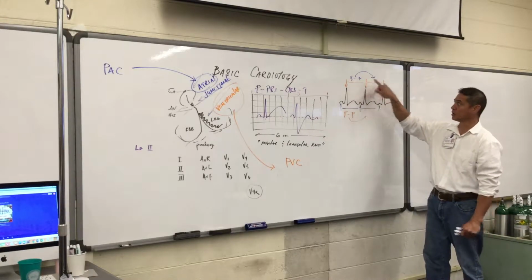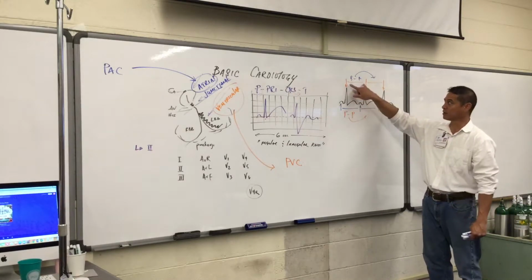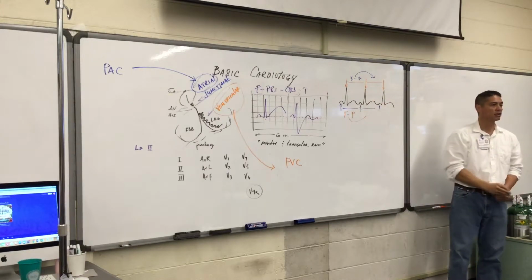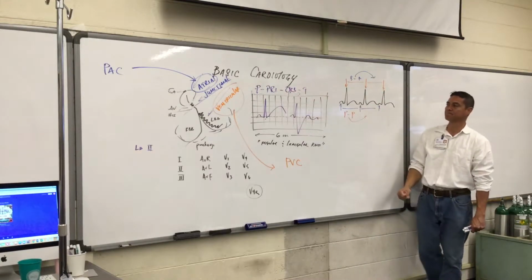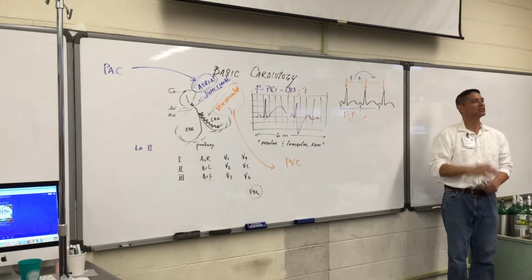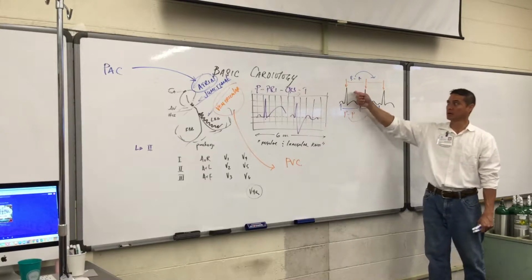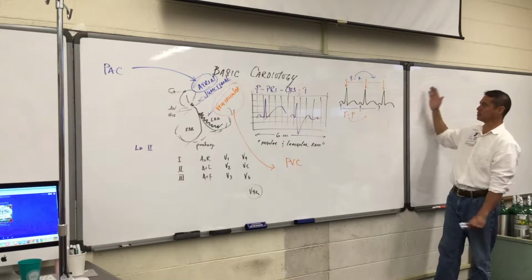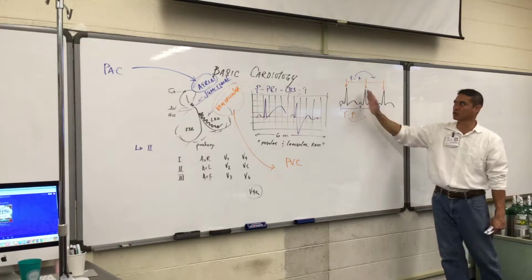The same thing occurs with the R to R. And if this is a sinus rhythm, you'll note that the R to R intervals are the same as the P to P interval. And therefore we have not only all the criteria that we met, all the P's, we have a PR interval, we have a QRS, and we have a T. The R to R and P to P rates will be identical as well. So when we measure this out, using the 6-second strip, if this was within the first 3 seconds, we would have 3 beats. We add another 3 beats in the next 3 seconds, we'd have 6 beats. This means that the ventricular rate is 60.